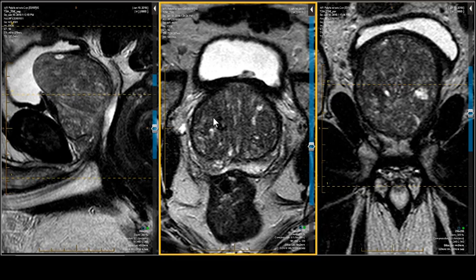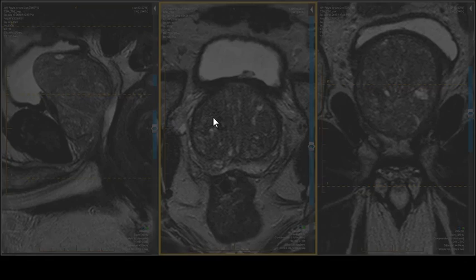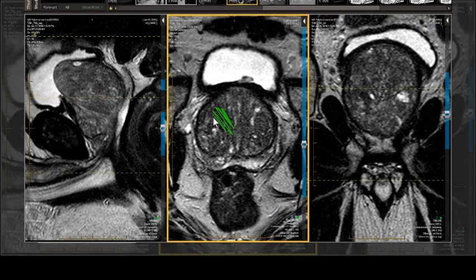You don't want to see anything that is smushy or gray or charcoal-like that erases this lobular, nodular anatomy within the gland, and you certainly don't want to see anything that crosses the surgical capsule, which is right here, going into the peripheral zone, or crossing the anatomic capsule, which is right here.